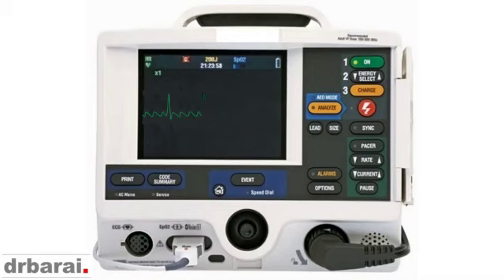Now atrial flutter usually comes regularly. In this case, this is a 3:1 block, so for every 3 P waves, there is 1 QRS complex. Sometimes you might find the heart rate is 150 and there is atrial flutter. This is a 2:1 block, so for every 2 P waves, there is 1 QRS complex. It can be a 4:1 block when the heart rate is 75. So that is atrial flutter, which is regular.